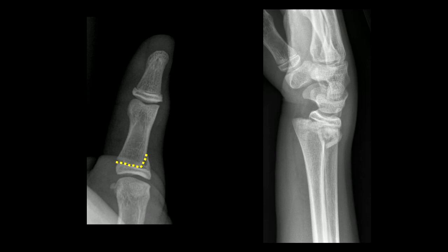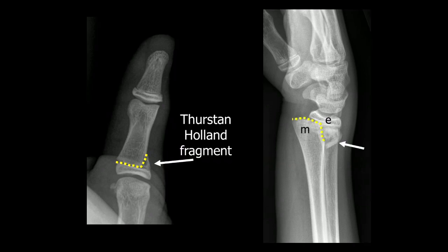The same type of injury might result in an ulnar collateral ligament injury in an adult or a skeletally mature child. On your right is a Salter-Harris type 2 fracture of the distal radius with substantial displacement of the distal fracture fragment.